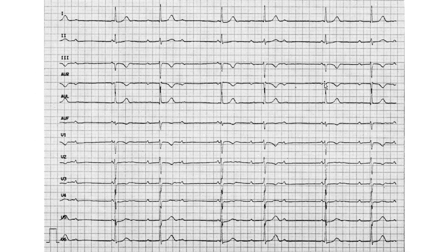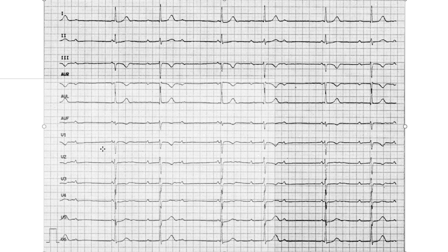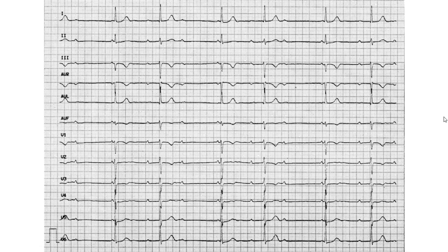Oh, sorry, I forgot to mention the heart rate. Clearly, there's bradycardia. 1, 2, 3, 4, 5, 6. By 6 is 36. The guy's got a very slow heart rate, dangerously slow. You mark that as a pathology.